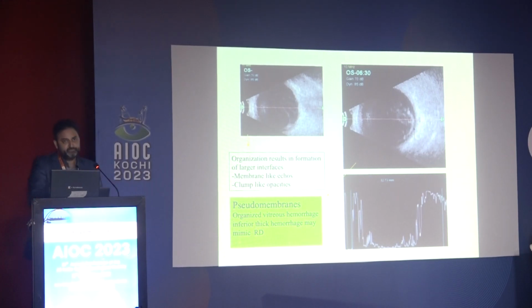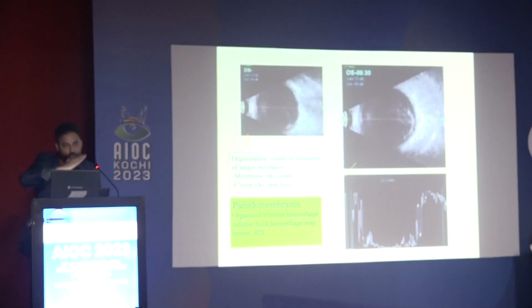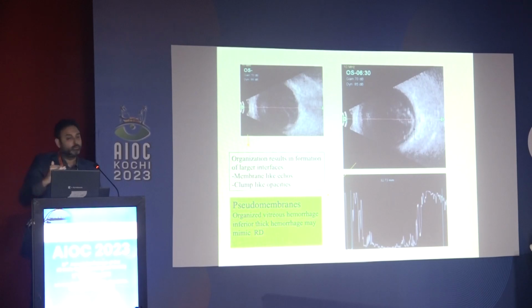And ultrasonographically, the uniformly low echo intensity on A-scan will now no longer be as uniform, because there will be some part of the blood which is dehemoglobinized, some which is not. So depending on where you pass the scan from, it will be high or low.